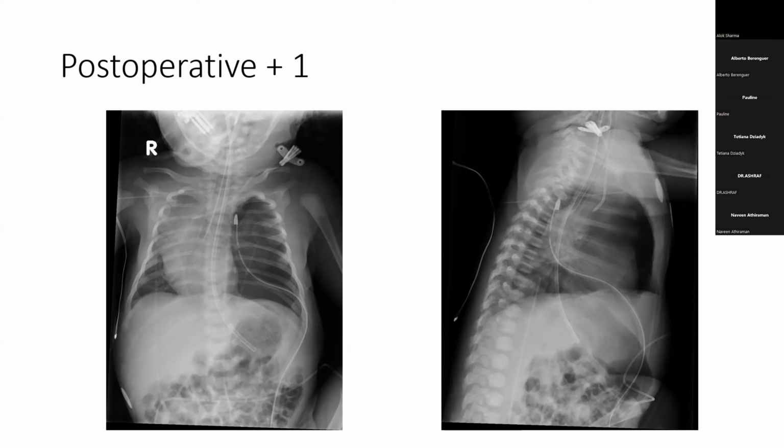Now, often we describe this area. Can you see the marking there? What my radiologists, when I used to ask them, basically call it herniation of the visceral pleura. Because you've got a significant amount of air, the pleura tends to herniate to this side. It's very similar to the kind of line that you see when you have a perforation and you have the ligament of Teres outlined in the liver. But I think what you've beautifully demonstrated in this X-ray is the anterior pneumomediastinum. And it's so beautiful that you guys are getting lateral views.